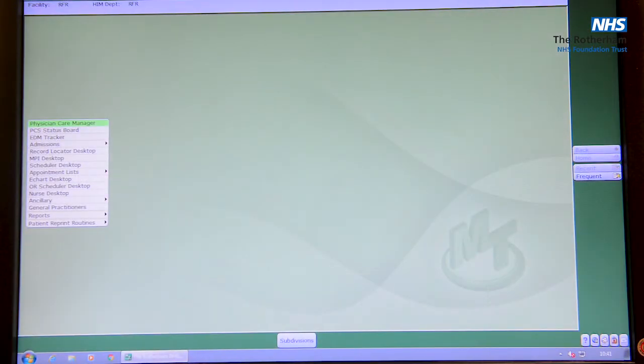Welcome to the Electronic Neurological Observations training video for UECC. The aim of this video is to demonstrate how to record patients' neurological observations using the electronic form in Meditech. By the end of this video, you should feel able to use electronic neurological observations, or e-neuro-obs, in your daily nursing care. Here is the step-by-step guide to completing e-neuro-obs in UECC.